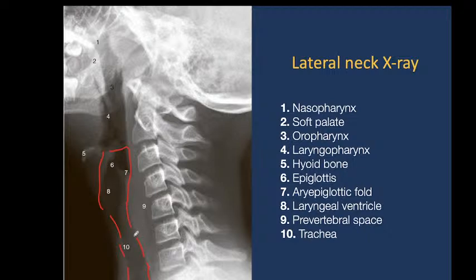So doctors don't need to inject some liquid inside of larynx or trachea. It's easy. Usually we don't see the esophagus here, but we couldn't see the inner structure in this organ because it is not contrasted.